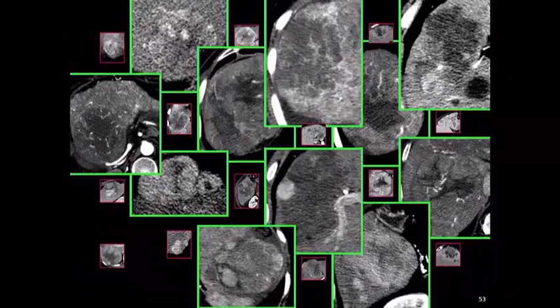So if you can tell me with 100% certainty, then you are clearly a very, very good radiologist, because I certainly can't tell you. So I have to cheat. And there it is. The strawberry ones were the metastases and the green ones were the HCCs. Okay, but anyway, mosaic masses are malignant.